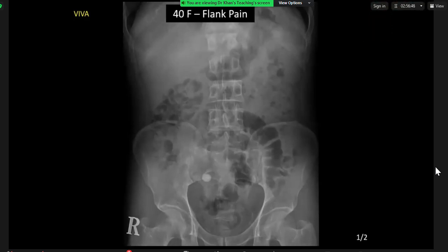Slightly anterior or slightly superior to the superior pubic rami, I can see a well-defined wall to the bladder, which is slightly dense. It doesn't go through the whole bladder, but it's mainly in the inferior aspect. I can't see it throughout the bladder, so I don't think it's actually gas. It may represent calcification within the bladder itself.